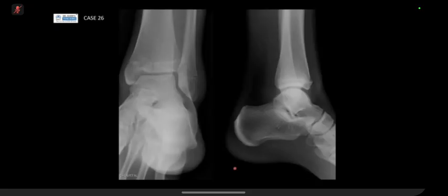So I think it's a point just to make that when you're reporting pediatric films, take a close look at drawing all the contours. And anything, any lucencies, you should be able to define it. And if you can't, look at Keats first to make sure it's not a normal variant, and then after that you can explore the other differentials.